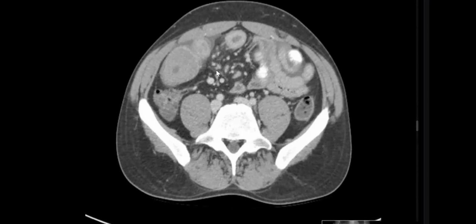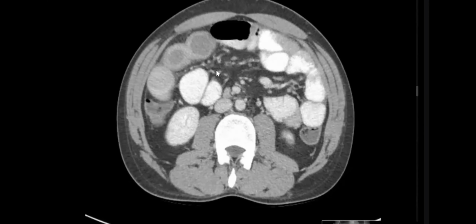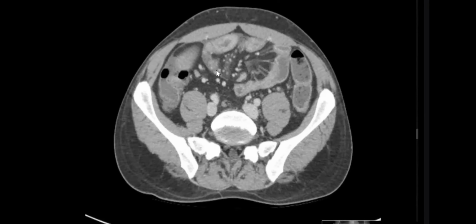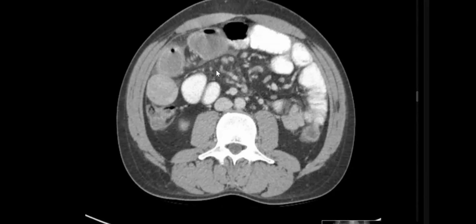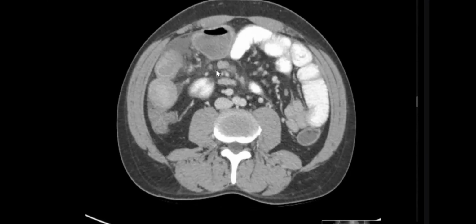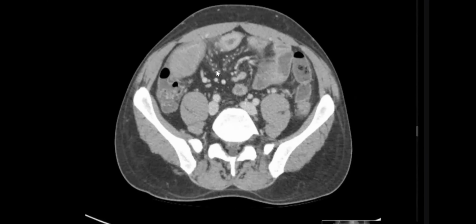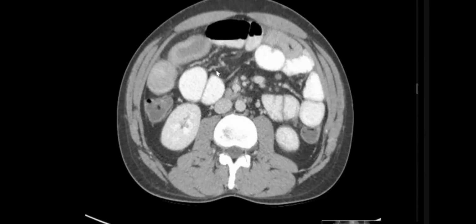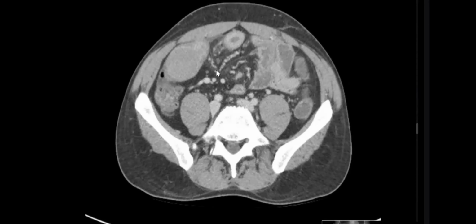What about other findings? There is a related collection to this bowel. I'm just still tracing. Collection or reactive fluid around? Reactive fluid, because collection means abscess, for example. Okay, good. So we have a segment of the ileum showing mural thickening and hyper or hypo enhancement.